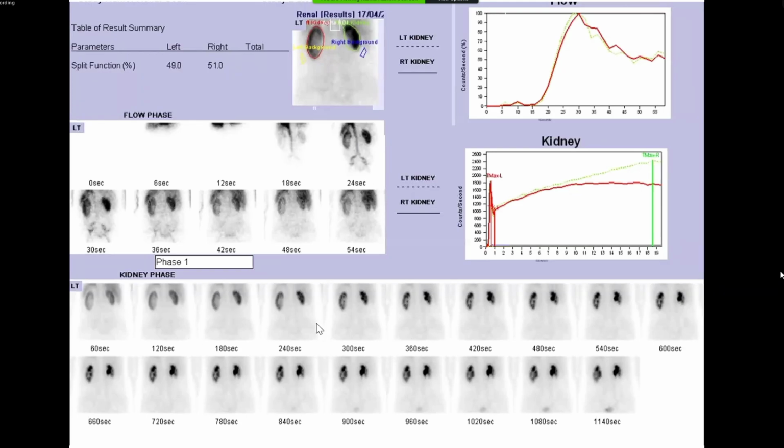Now, when you come to the uptake, you can make it out. The left kidney is relatively large compared to the right. The right kidney has much better cortical uptake compared to the left kidney. As we go beyond certain minutes, earlier there is no urinary bladder, but faintly you start to see the urinary bladder coming in, meaning the excretion has started. And on the right kidney, the contrast has come and is holding in the renal pelvis. The cortical clearance has occurred, but it is still in the collecting system and hasn't completely cleared. A completely normal kidney should clear within 8 to 10 minutes.